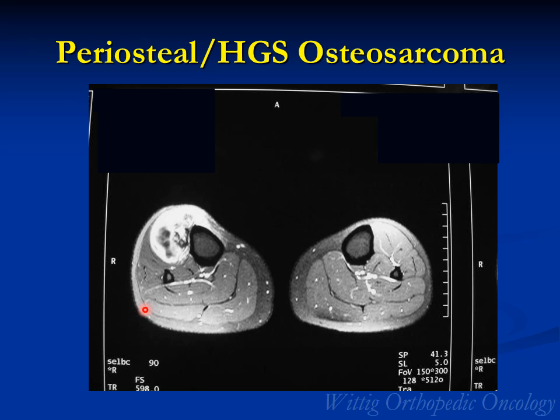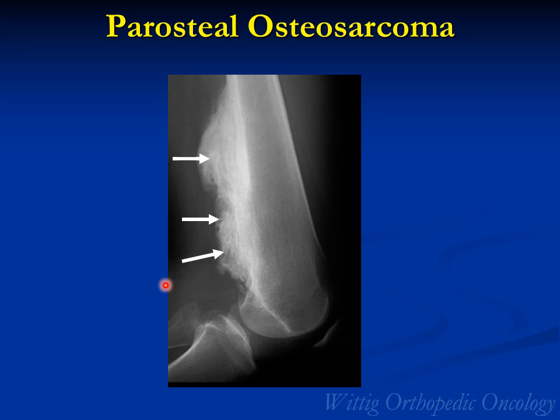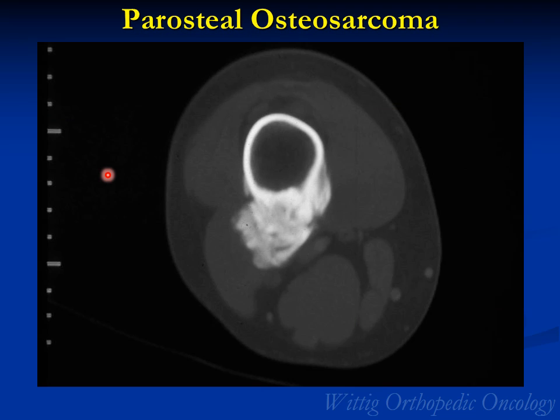Most commonly occurs around the tibia. The dark areas probably represent bone formation. And this is an example of a parosteal osteosarcoma occurring on the posterior distal femur, the most common location, arising on the surface of the bone, which is heavily mineralized with a fluffy and cloud-like density, demonstrating ossification. Here's a CAT scan of the same tumor.